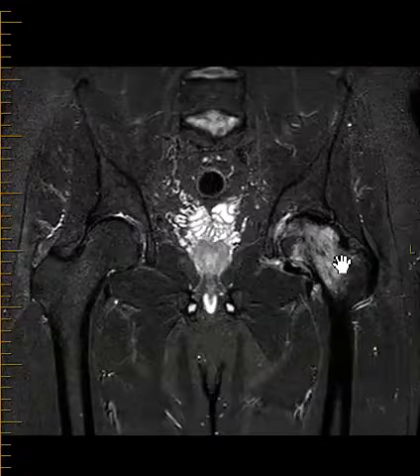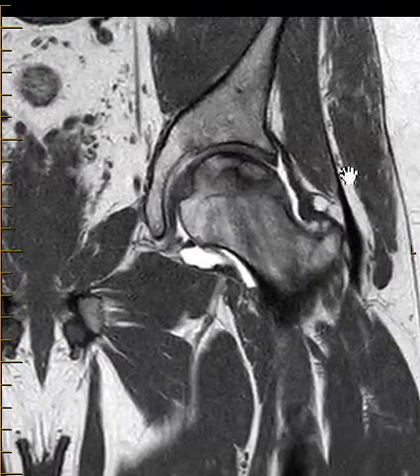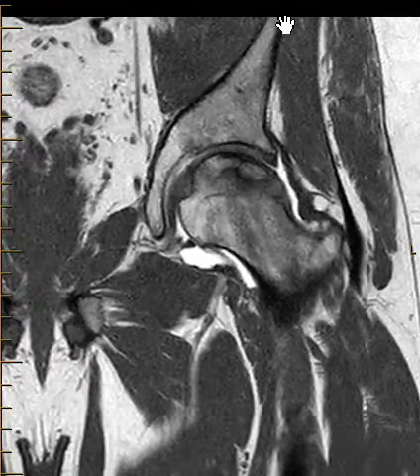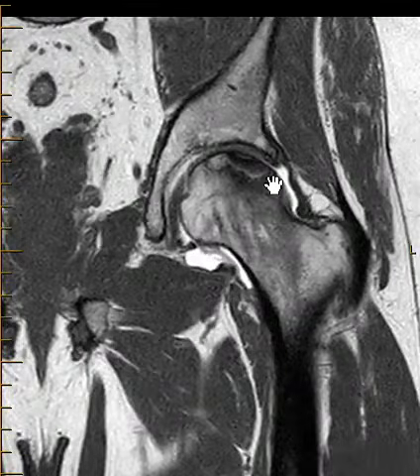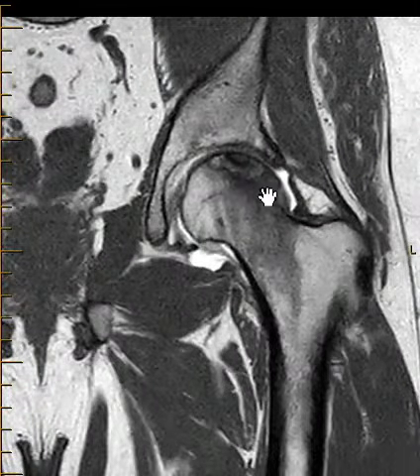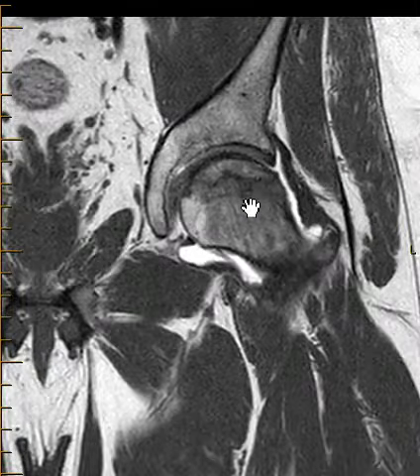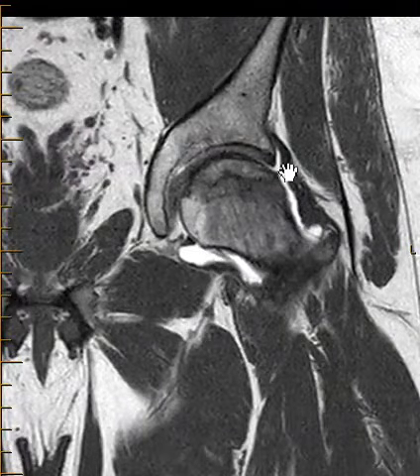And so we're going to look at this a little bit more closely on another view called a T1 weighted image. So T1 has fat being bright. So this is subcutaneous fat, very bright. Fat in the pelvis bright. You can see the marrow contains a lot of fatty materials. It's pretty bright. And we can see that the femoral head has these bands where we don't see that typical uniform brightness. And these are bands of low signal, bands of bone increased density, bands of bone sclerosis. So these serpiginous bands of bone sclerosis beneath the articular surface.